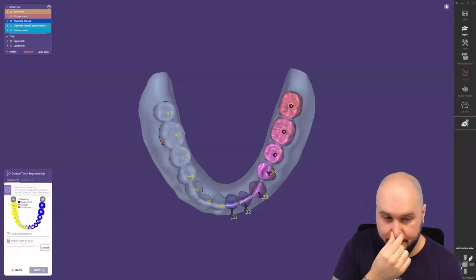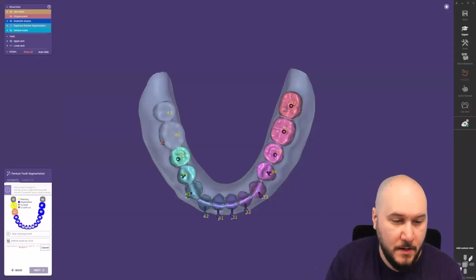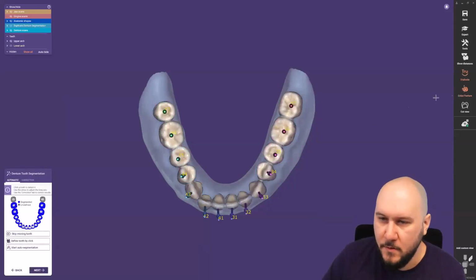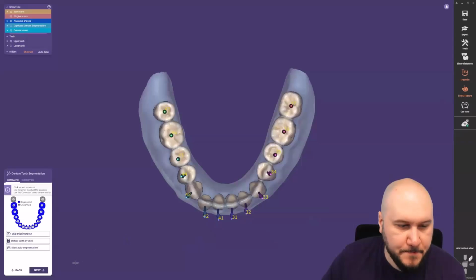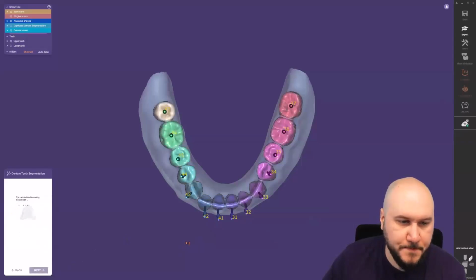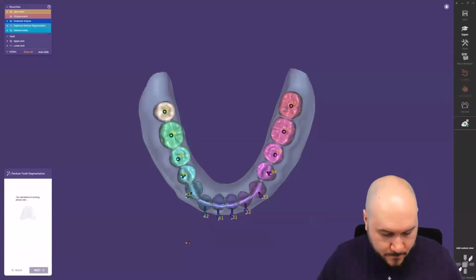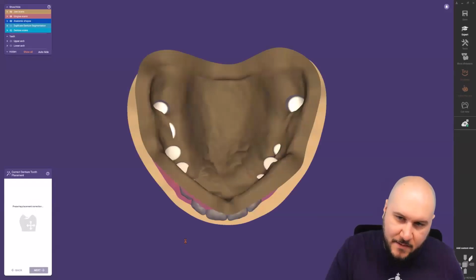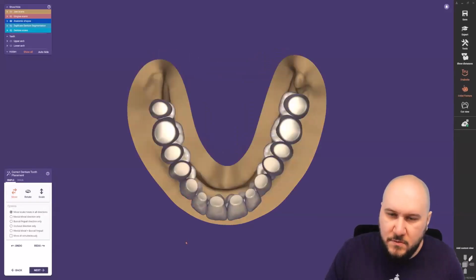Okay, good, perfect. And also add the color texture again, and then we'll jump to the next one. But now, when we talk about duplicate denture, the software does exactly what the duplicate denture means. And we are, I think, to tell about this.